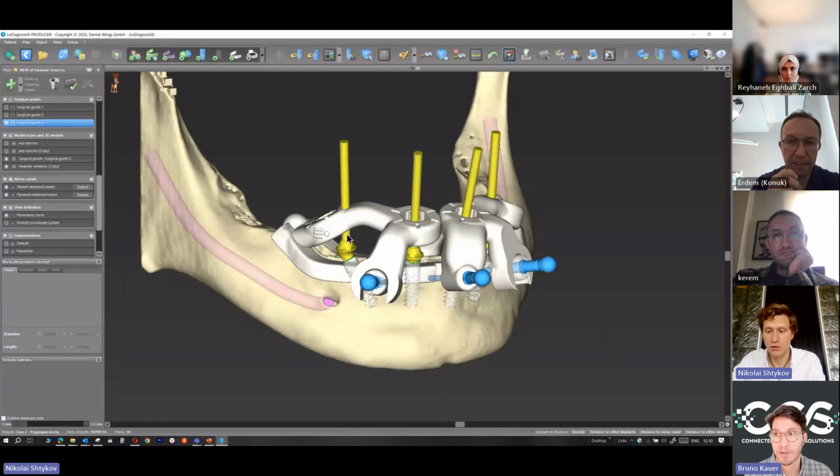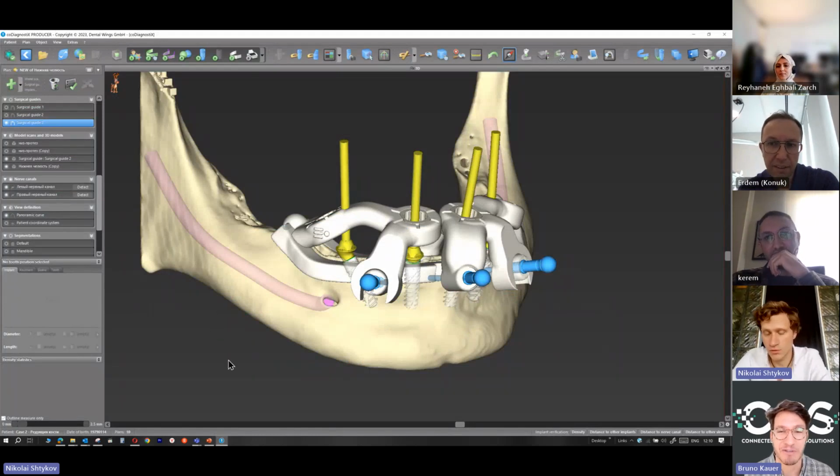Oh, this is super important, and thanks so much, Nikolai, for showing this video. Actually, if you can share it with me later on, that would be amazing, because most of the labs and most of the clinicians sometimes don't know how to calibrate, and this explains it very easily. That's quite good. This is a really good thing for calibration.